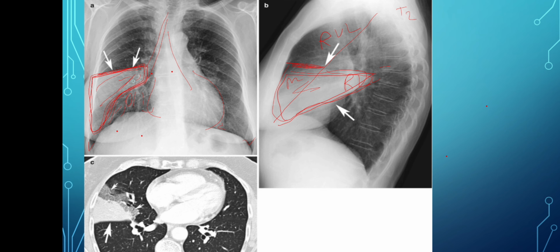Why not lung mass? In a lung mass, no bronchovascular markings are seen, but here bronchovascular markings are seen. So this is a diagnosis of pneumonia. Right-sided lower and middle lobar pneumonia without any parapneumonic effusion, because the angle is acute, so there is no parapneumonic effusion.